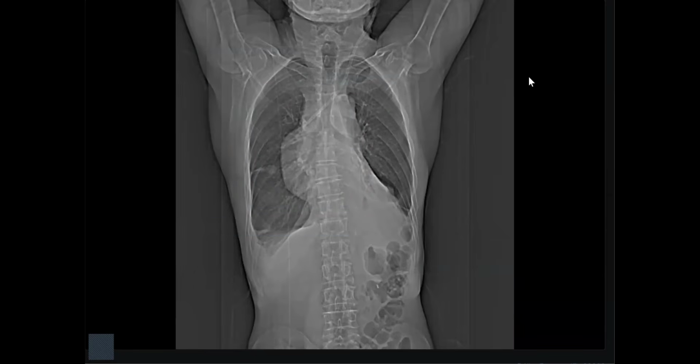This is just one image you can comment on, then I'll give you the CT cuts. This patient has some chest pain and dyspnea after a dialysis session. What do you see?